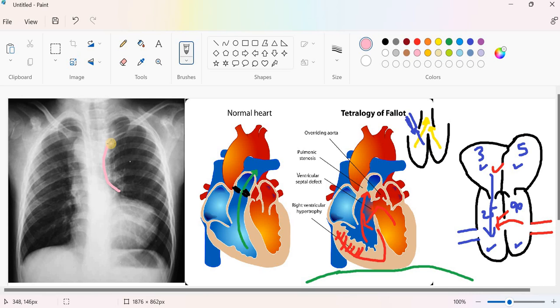It doesn't show you the small tiny projection that denotes the presence of the aortic knuckle and pulmonary artery. Why is that? At least for the pulmonary artery, the stenotic valve makes the blood prefer to go through the aorta instead of the pulmonary. So the pulmonary shadow is not prominent, because there is not much blood passing through that artery. So this is the narrow part of the boot-shaped heart.